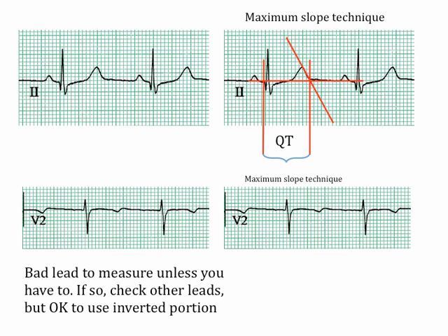In the lower panel, here's a lead with a low amplitude T wave, so I generally discourage you from reading this, but the same technique can still apply. Once again, what we do is we identify that isoelectric line, similar to last time, the onset of the QRS, and then use that maximum slope in the upslope to identify the end of the T wave and the QT interval.